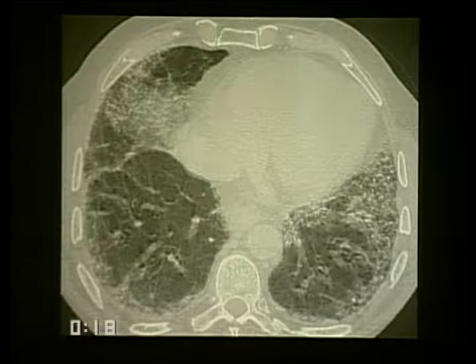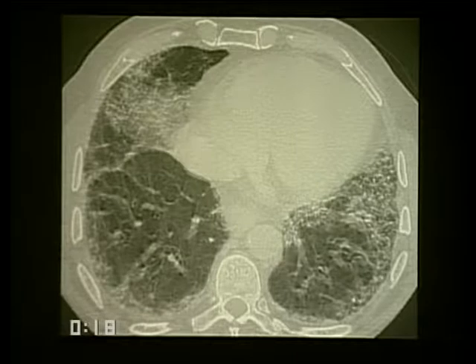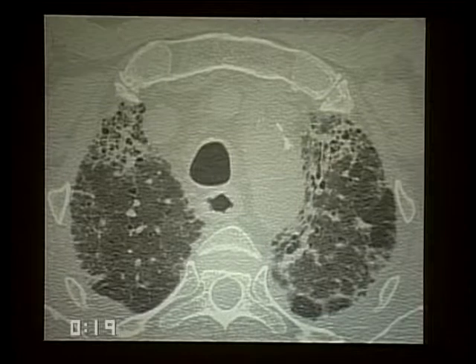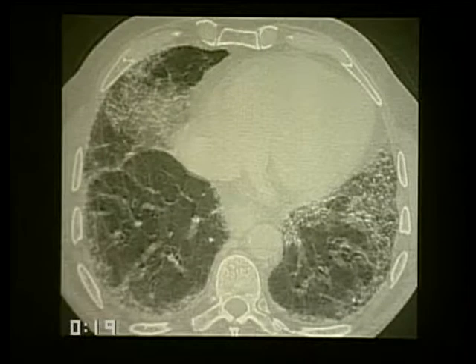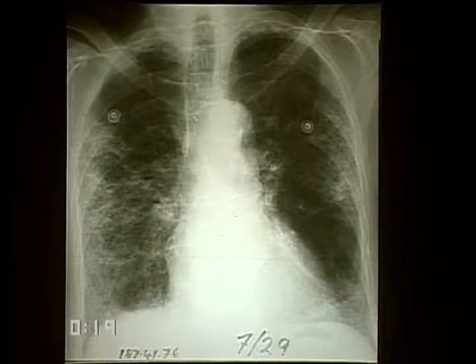It is non-specific. It can be due to a wide range of provoking agents, and on examining these lesions histologically or radiologically, it is quite commonly impossible to tell what was the provoking agent. The characteristic which defines that it is fibrosis is when you see bronchi or bronchioles dilated within it. That will indicate that there is traction bronchiectasis, which pulls the airways apart.